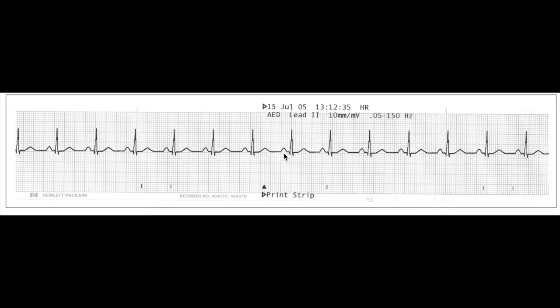So we can say this is a standard PR interval, and they are the same across all of them as well. If we look at the QRS complex, it's about 2 boxes. It's sharp, narrow, so we can say this is less than 0.12 seconds. So our interpretation of this is it's a sinus rhythm because we have that P wave before every QRS complex, and we can say that they cause the QRS complex as well. The QRS complex is narrow.